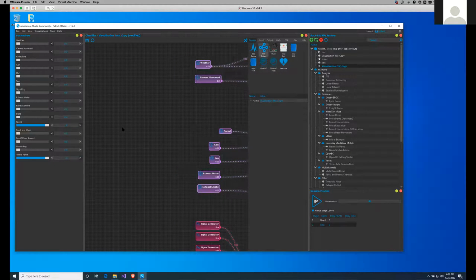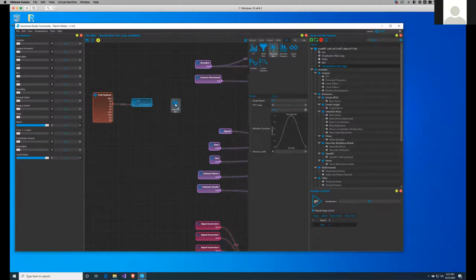So to keep it simple, we use our test device. The test device that we have in the studio and sensors just randomly creates EEG data. And I'll quickly set it up. So we say we care about CZ, we do an FFT, and now we care about a particular frequency band. So we use out of DSP our frequency band node. We select alpha, it's pre-filled with like 8 to 12 hertz. Like always, if you want to change it, you say, oh, my definition of alpha is slightly different. Change it. You can also type it in if you want to have it more fine-grained.